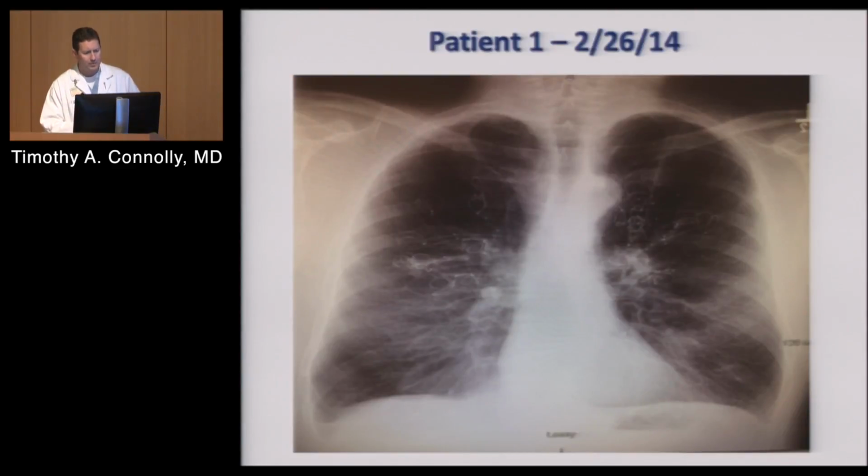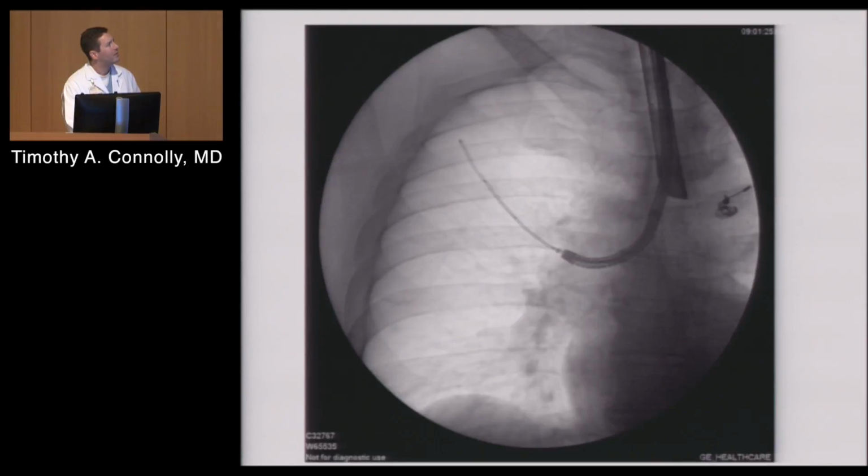This is an example. This is the first patient that we ever did. And this shows the coils in place after both lungs have been done, separated by 4 months, but this was once everything was finalized. It's important not for you guys to know much about this other than to look at this and not go, is this guy a terrorist? What's this going on? And we give them cards when they go to the airport specifically so they don't get harassed.